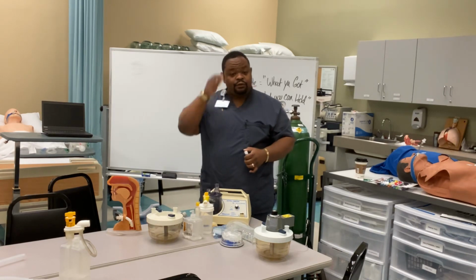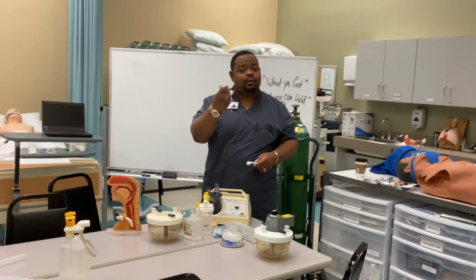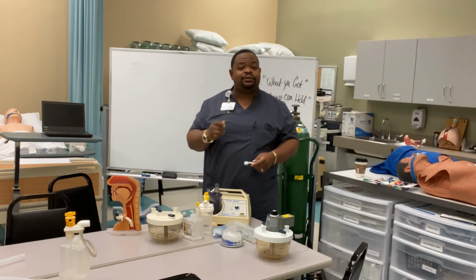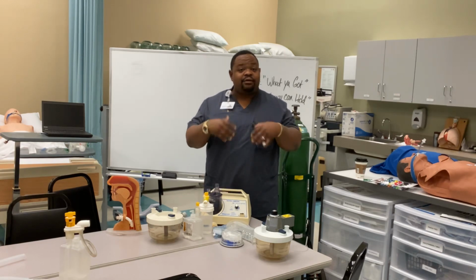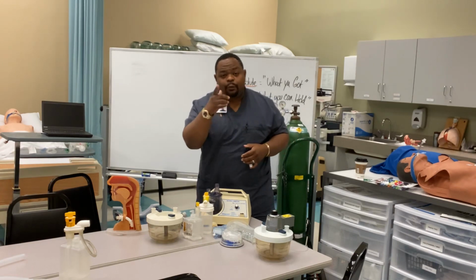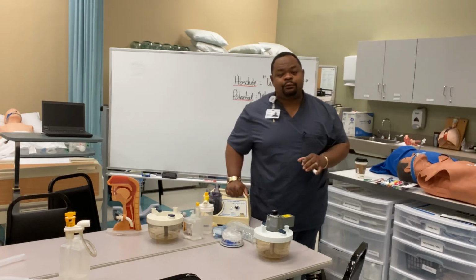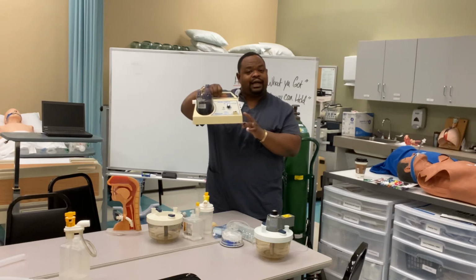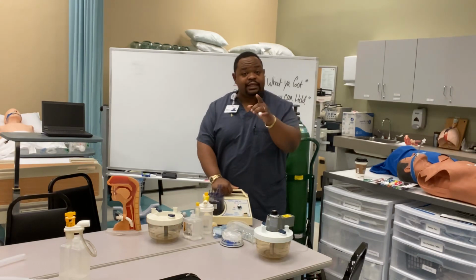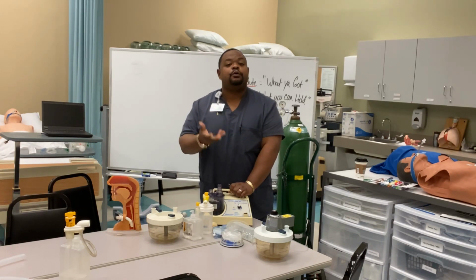Understand that? Now, you think 6 cc's is not a lot, but if you look at a syringe and look at 6 cc's, that's a lot of water. If I squirt that completely into your lungs, you're going to have a bad day, okay? But since it's aerosolized, it doesn't hurt you as much, right? So that's why we use it for sputum induction. We can use a hypertonic saline, which you'll learn in pharmacology, and put it in an ultrasonic nebulizer, and we can guarantee we can make you cough. We can make you produce some sputum, right?